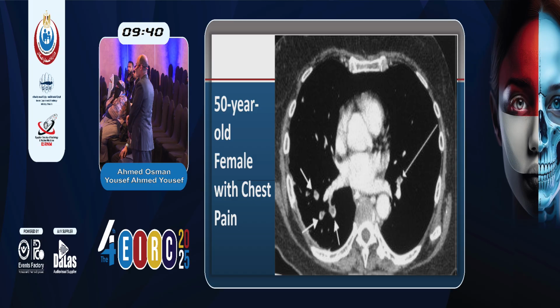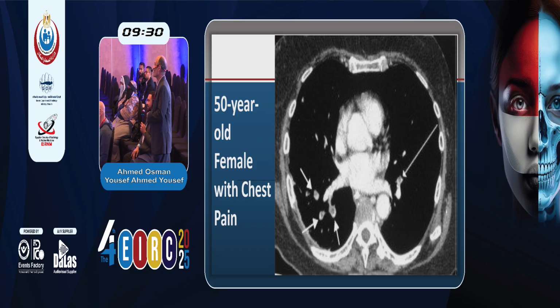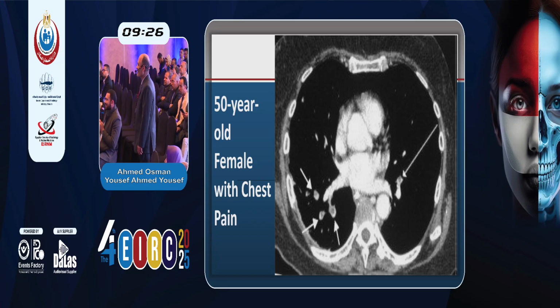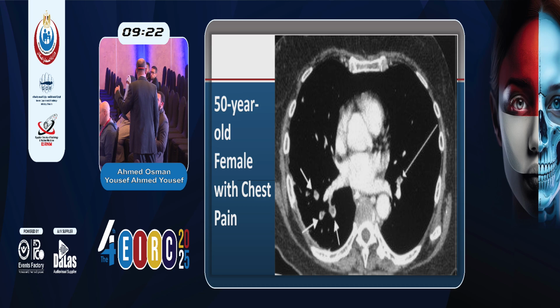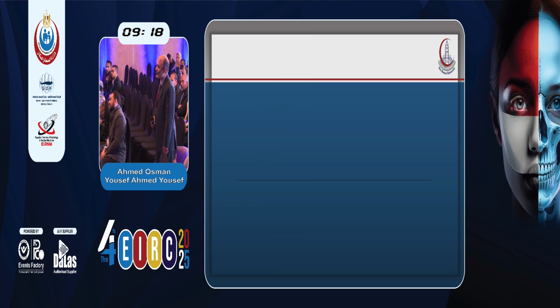A recommendation for all: no diagnosis of pulmonary embolism by image on mobile. Because he's right, maybe this is a pulmonary vein. Okay, we must roll up and down. But I told you nothing tricky. Yes, pulmonary embolism. This is the segmental branches of both pulmonary arteries.